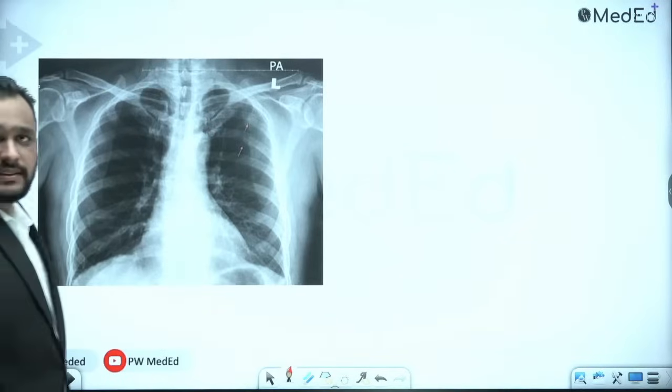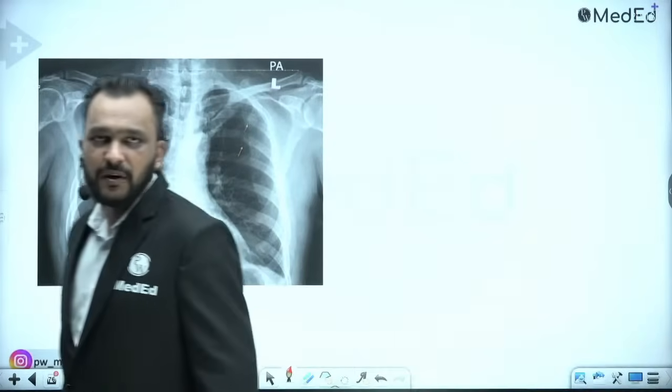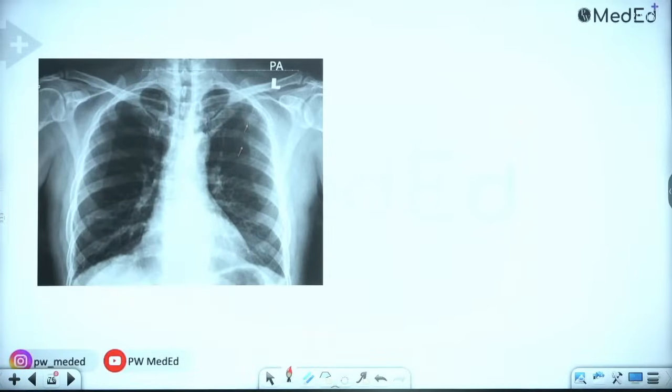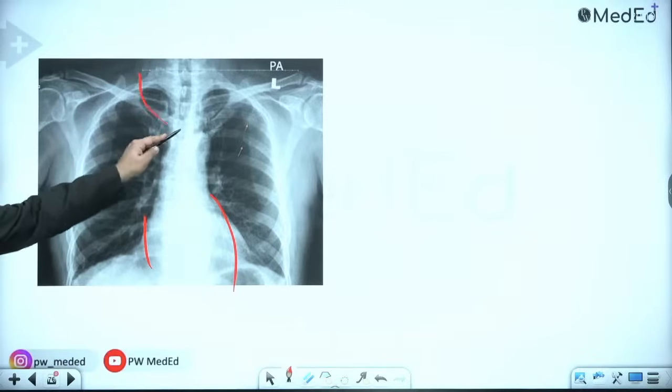Yashwant, Yuvraj, Angelina Jain, Sachin, what is your finding? You want more time? No, there is no bronchiectasis. No bronchiectasis is seen. Tubular heart, no, the heart appears normal in this patient. Anyone else? Cervical rib, no. This is the first rib. This is not your cervical rib.